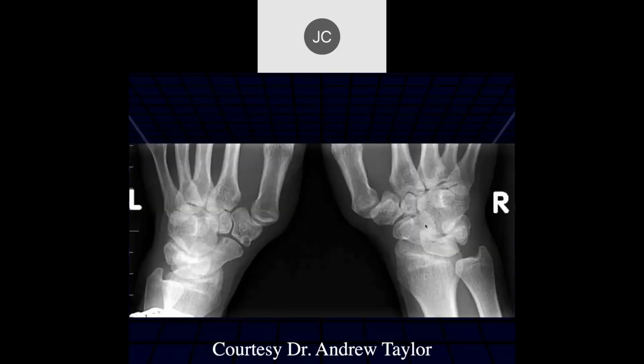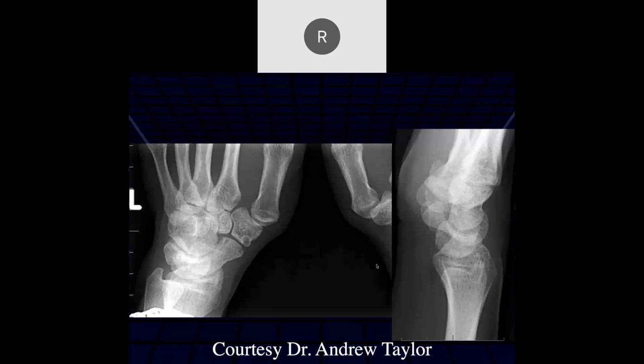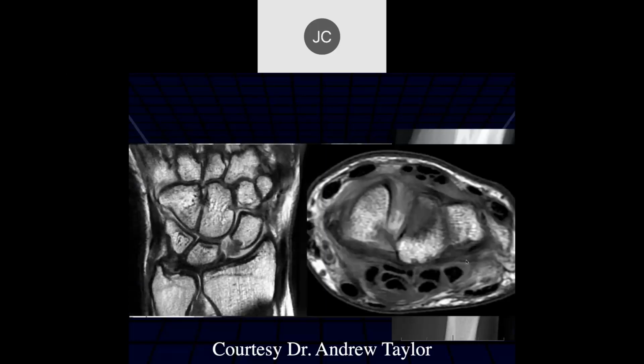Robert? All right, so we have some radiographs of the wrists, and the left wrist, all I see is maybe some degenerative changes of that triscaphe joint. Yeah, some cystic change there. And here, looking at the scaphoid, it looks like it's flexed a little bit. Maybe a little bit, but it's probably within normal limits.